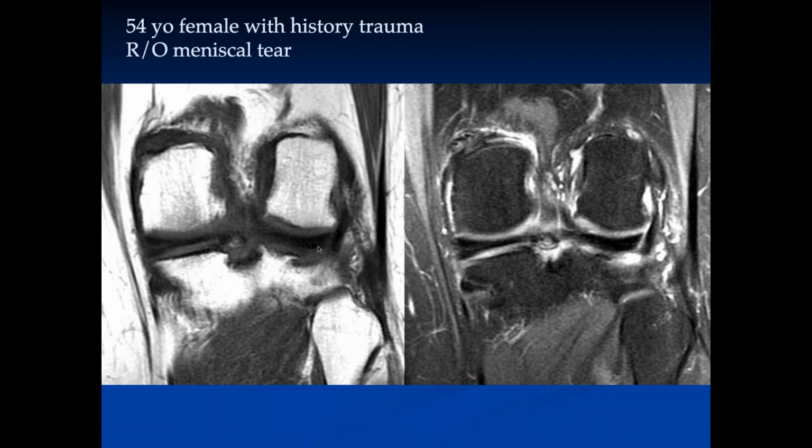Okay, Ashu, what do you think of this one? Okay, so we're looking at the posterior roots here.